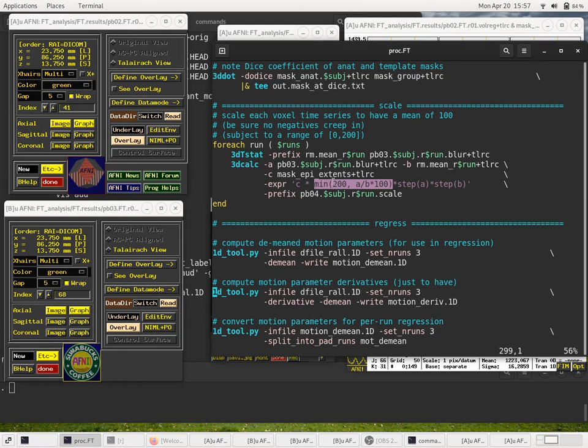So there's no point in going over 200. I could actually, if I wanted to some degree, there's no reason for not subtracting out the mean here. I kind of like to see the values positive, but it would be quite reasonable to subtract the mean, and then we could restrict this to 100 or even 50.